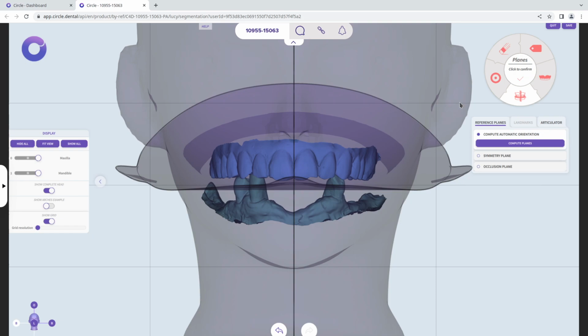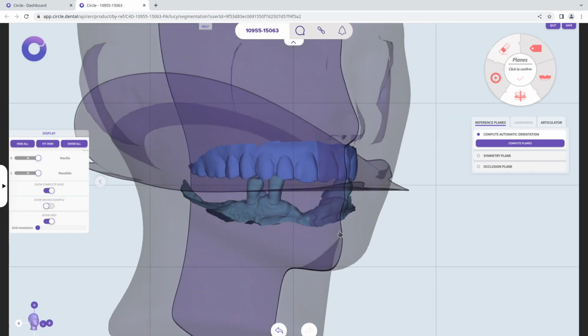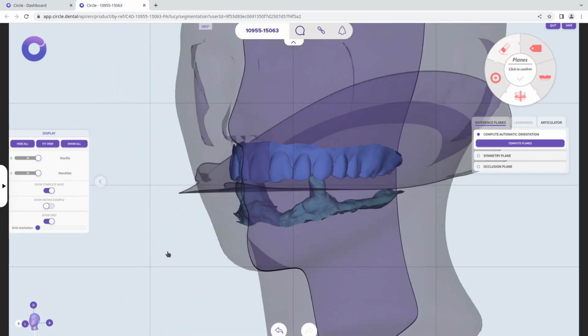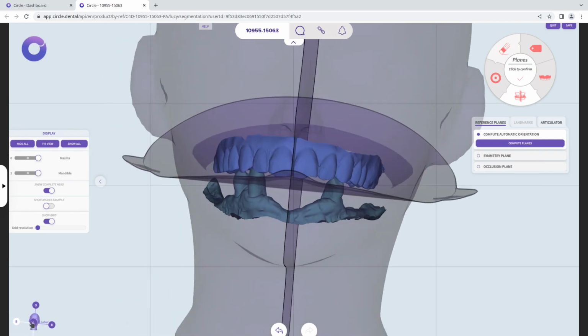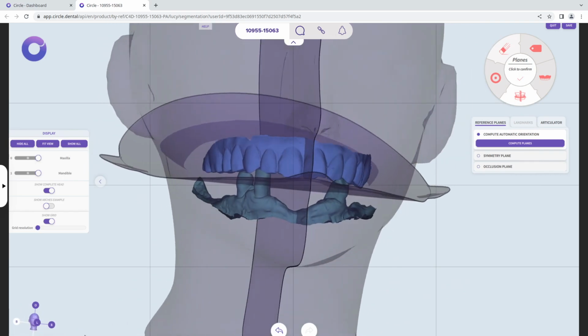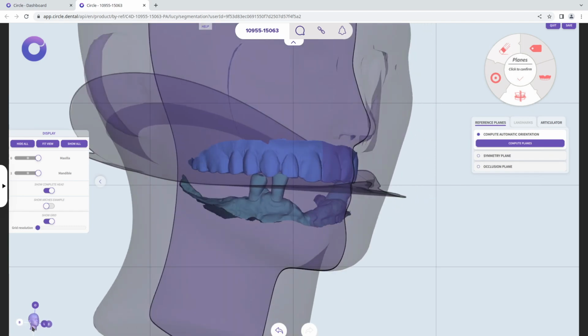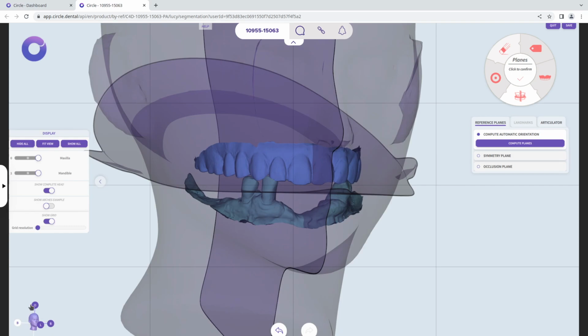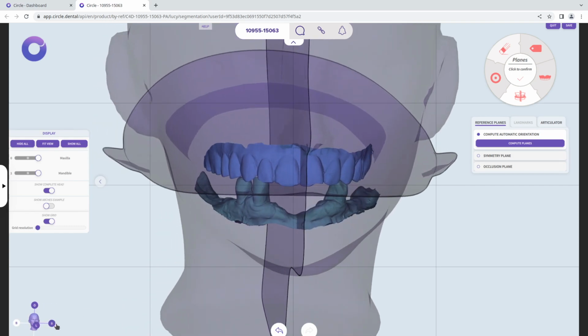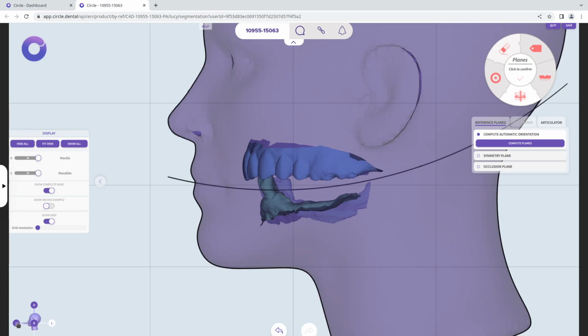So the plane tool is actually showing you the two symmetry and occlusion plane, as you can see here on the shape of the head. This was done automatically, and at the same time you see that the little gizmo at the bottom became a head, and with the different letters to show you what's seen.